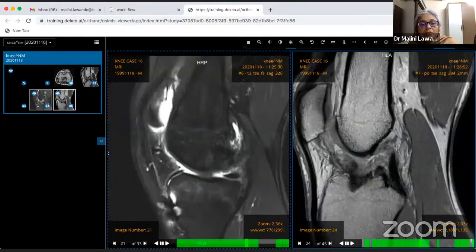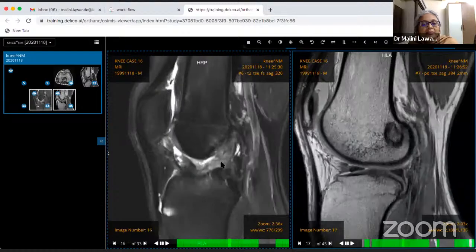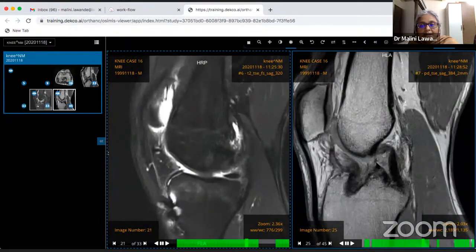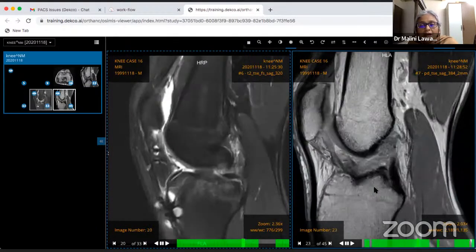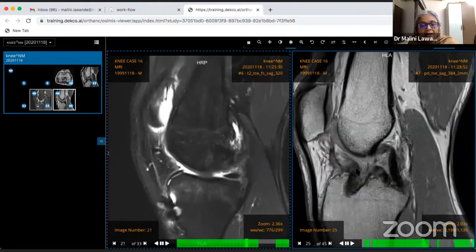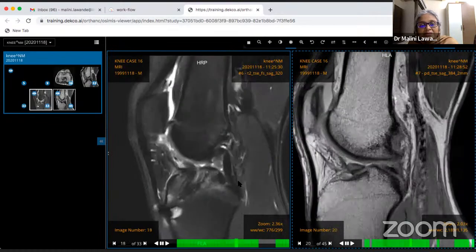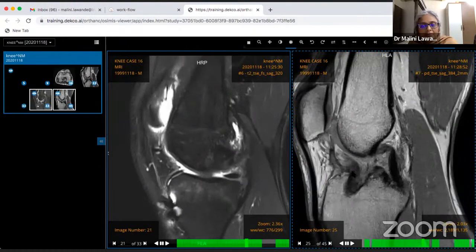Yeah. So you can see here, there is a high grade ACL tear in its mid portion. This is the femoral tunnel attachment. This is the tibial tunnel portion. But then here in the center, there is a tear. Now, what are these fibers out here? Is this an anterior intercondylar nodule? No, because remember, if a stump sparing surgery has been done and some part of the stump has been left behind for its function of proprioceptive fibers, that can look like this.